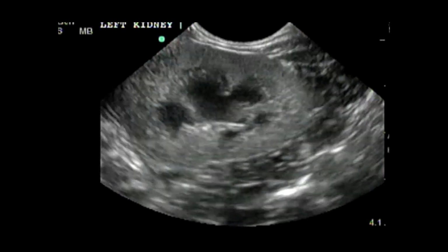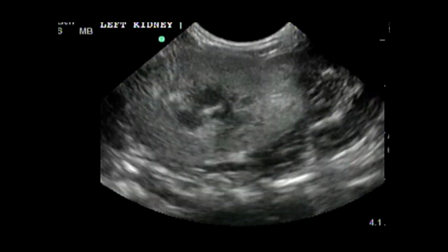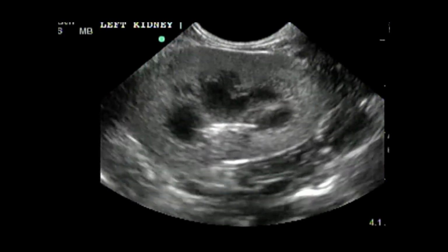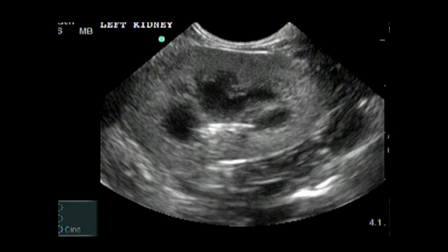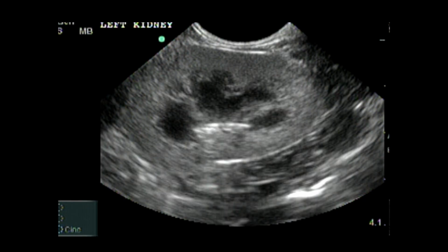The main difference between cats and dogs is that older, normal cats can store fat in the proximal renal tubules of the cortex, causing the cortex to appear hyperechoic compared to normal liver parenchyma. Hyperechoic cortex in dogs is abnormal.